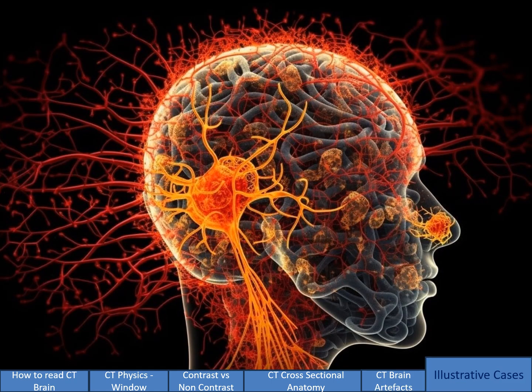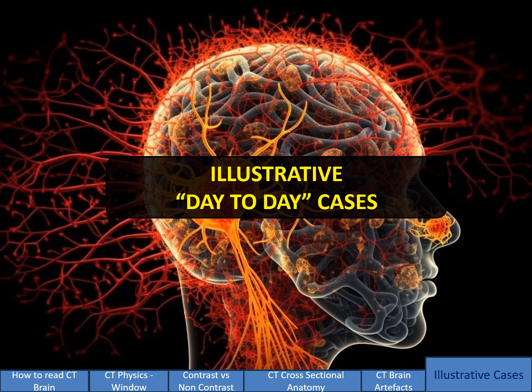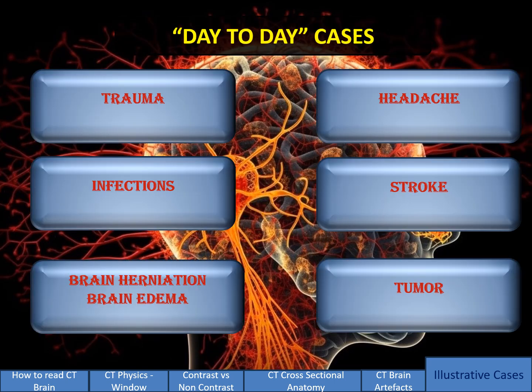Moving on to the illustrated cases. So I have listed some of the cases which we will be seeing in our day-to-day life. I divided them into 6 sections, namely trauma, infection, brain herniation and edema, headache, stroke, and tumor.